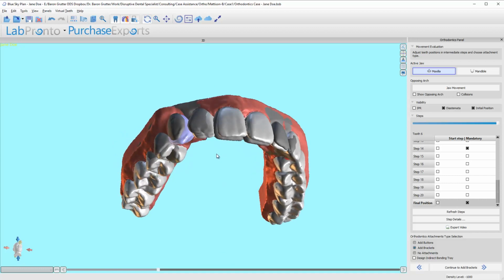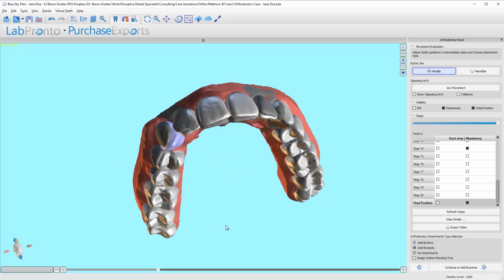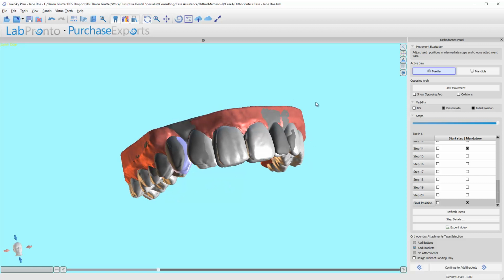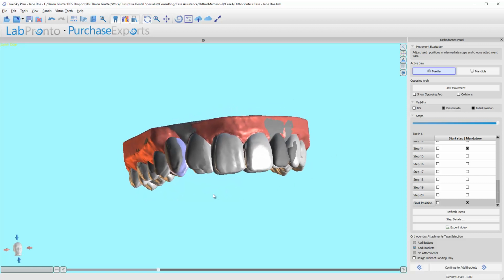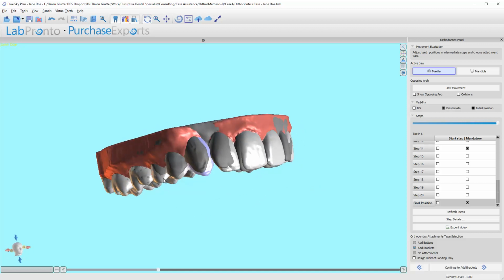But truth be told, the more I'm thinking about it, when you have a tray, you get to engage all the teeth, and so these 3 teeth back here, this entire side, all the way to the central, might be able to oppose and help to pull those teeth down. You're just going to get a little bit of under treatment because the plastic is going to deflect a little bit, so it's not going to fully erupt that much, but I think we could probably get most of it. So again, horizontal rectangle here, here, here, here.